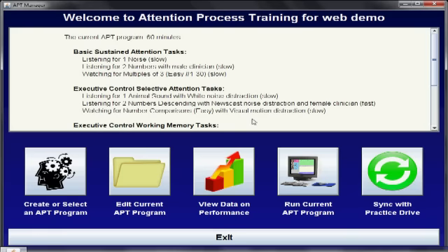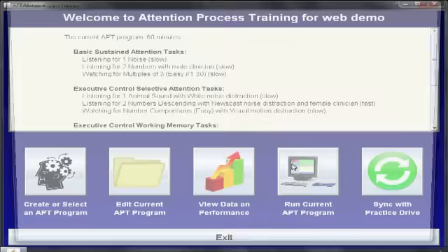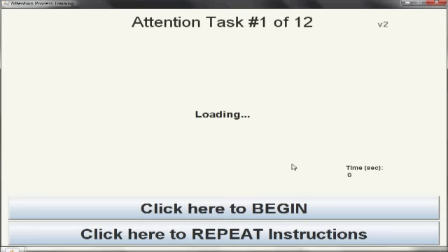We'll also show you how after each activity, the user is asked to rate how difficult the activity is, and it also graphs the scores. You'll also see as you watch this demonstration that I made some mistakes. Some of these are really easy, and some of them are a lot more complicated. So this is a real-life example that you see with my errors as well as what I got right.